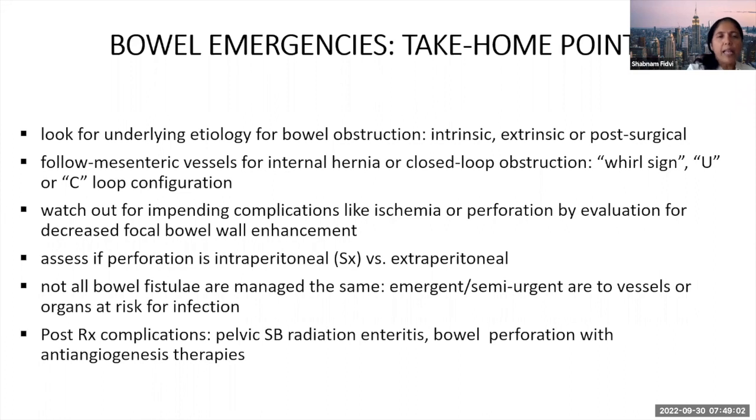Remember always to evaluate for decreased focal bowel wall enhancement, which is a harbinger for subsequent ischemia and perforation, like the case of metastatic ovarian cancer that I showed you. Remember, you have to tell your surgeon whether the perforation is intraperitoneal or extraperitoneal, because these are managed differently. Intraperitoneal is surgical versus extraperitoneal, which is usually conservative management.